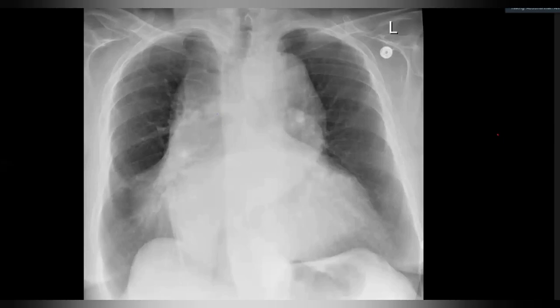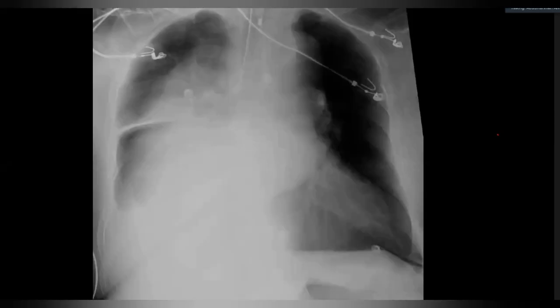So what's your diagnosis? Remember the first chest X-ray I showed you, a patient very unwell. You told me about all of those findings. This was a few years earlier. So coming back to this, what's happened to this patient? What is the diagnosis? Maybe this has ruptured now. Ruptured what? The aortic aneurysm has ruptured. This is a periaortic hematoma or ruptured aneurysm. Where? Of what? Ascending aorta and arch of aorta.